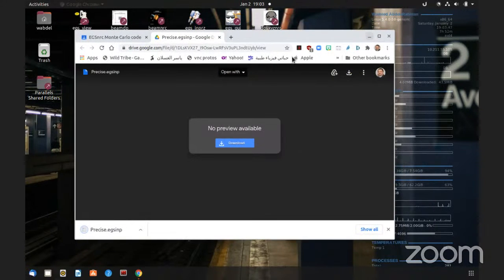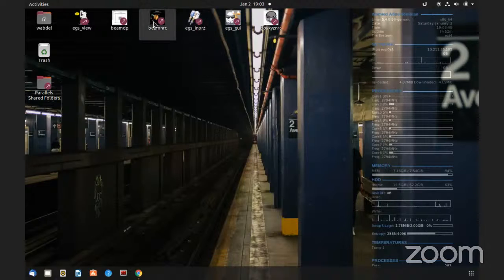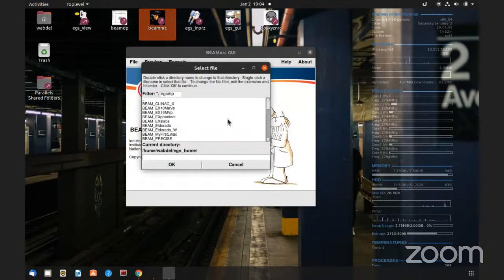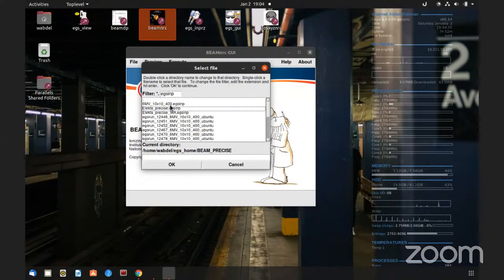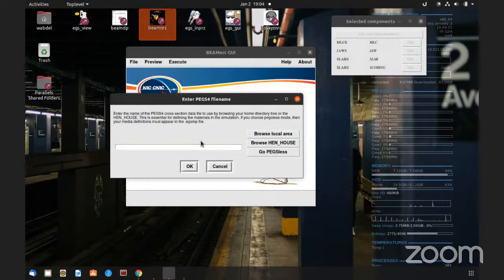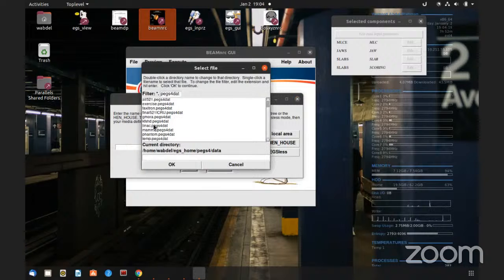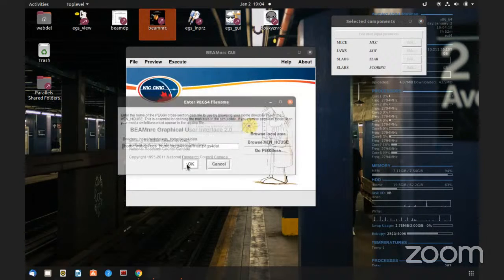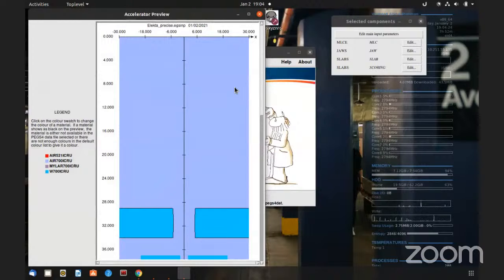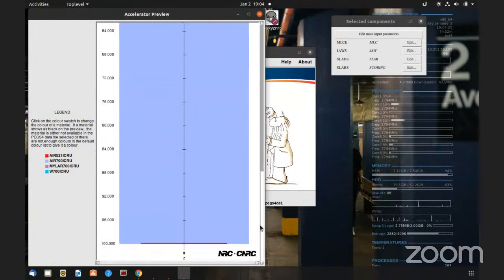So my understanding is you have a phase space file above the JAWS or the MLCs, right? Okay. So when we go and look at your input file, this is your input file. And yes, we'll open a fixed data file. So this is your accelerator.